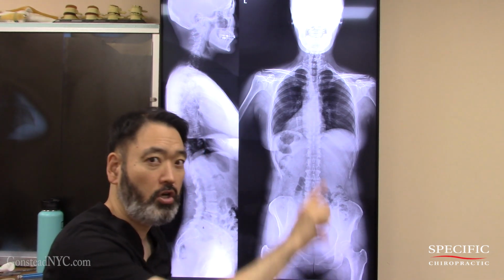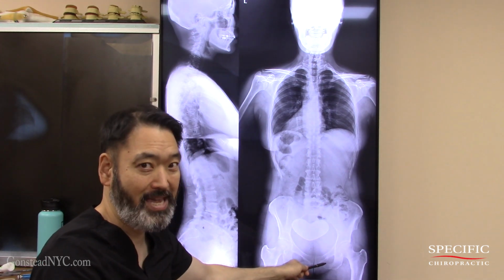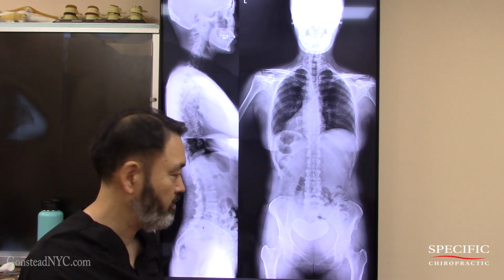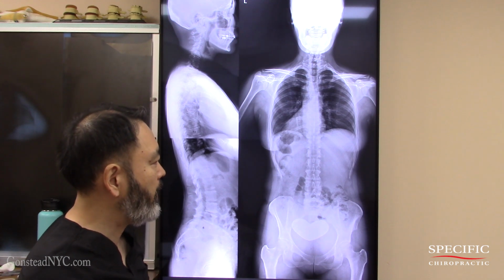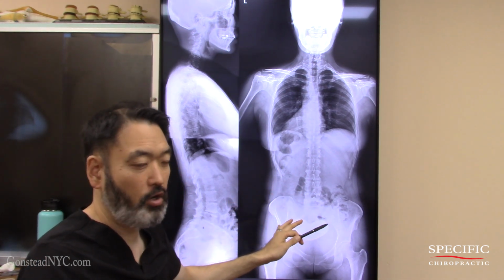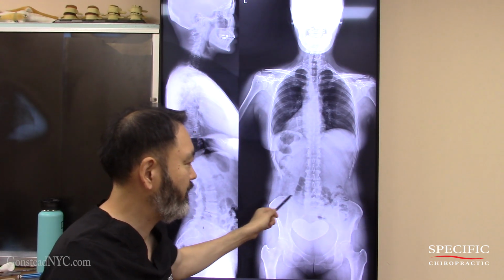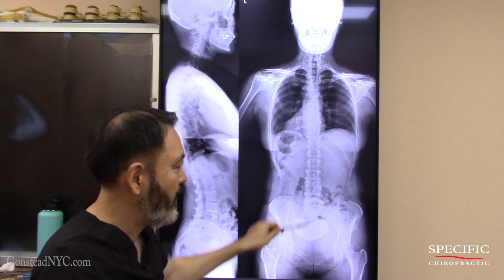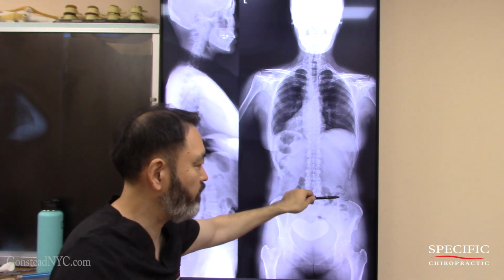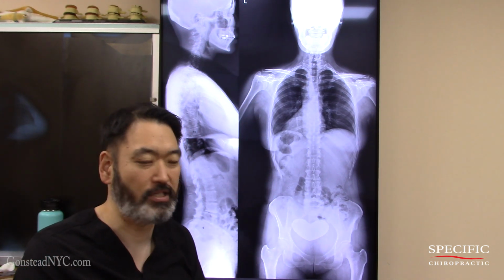Next we compare the obturator foramen height. This one's height is shorter, so potential AS. This one is taller, potential PI. Now, what is altered, and what's throwing the curveball here, is that normally I want to see a peak like this one over here, which would be an indication of PI. And I also want to see this side flat, like this one over here, an indication of an AS.